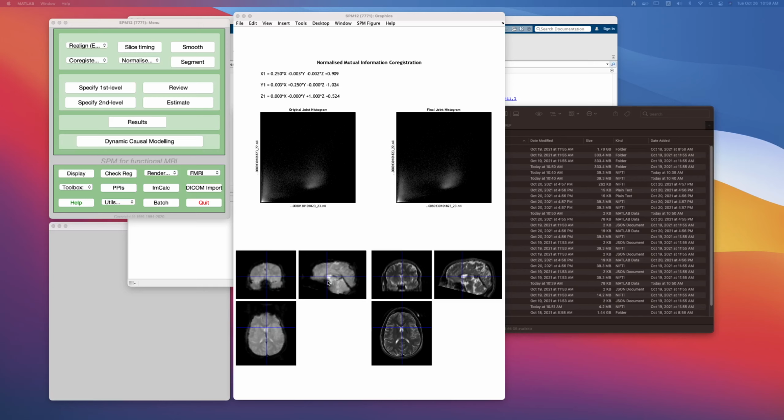So that you can use not only the temporal resolution of the EPI, which is now matched to the structural resolution of the T2, you can then match the T2 structural resolution to the T1 isovoxel resolution in all directions. When you bring all these together, you can use the T1 to match to the common template that everyone uses, because it has very good structural information equally in all three directions.